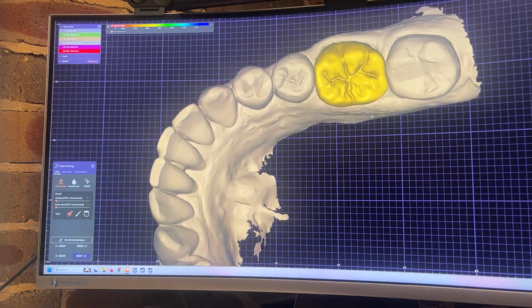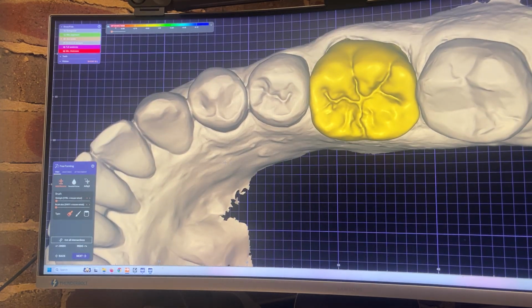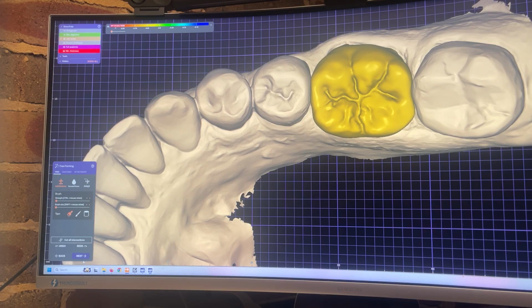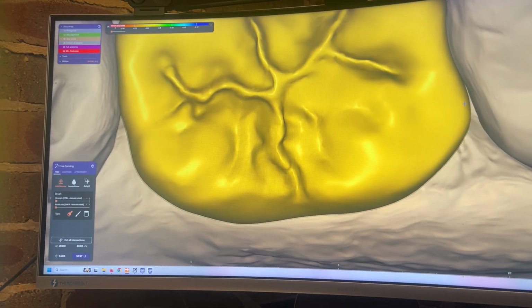So that's pretty good, I think. And then from here, normally because Scott wants a short video of the design, and 99% of the time it's that, yep, he's pretty happy, just go ahead. Let's close this.